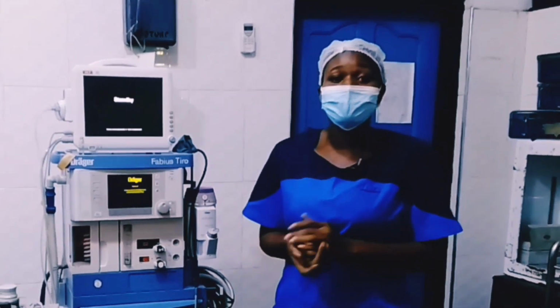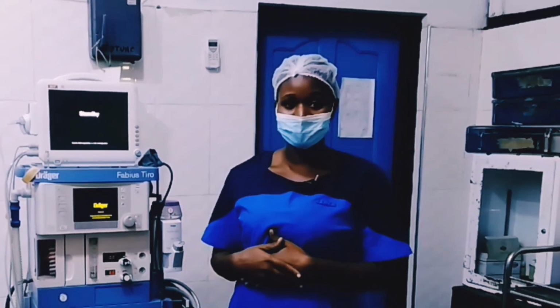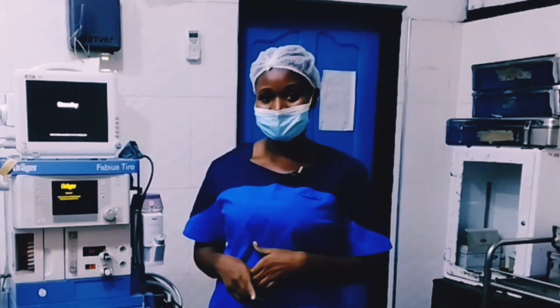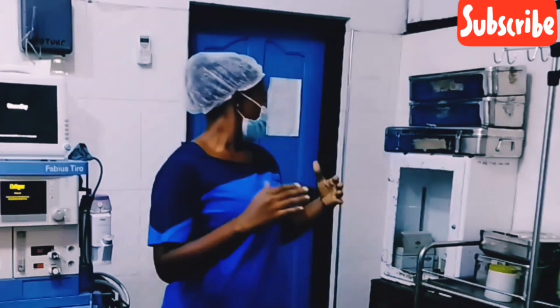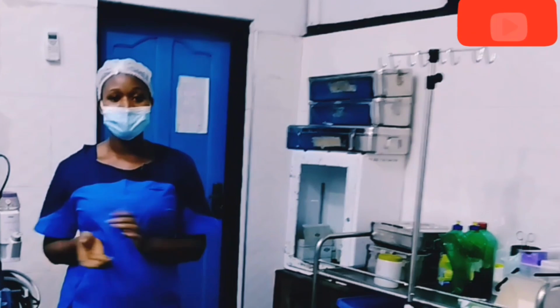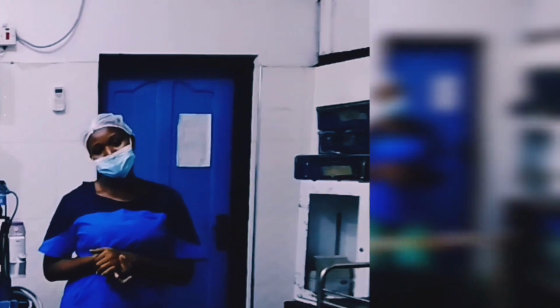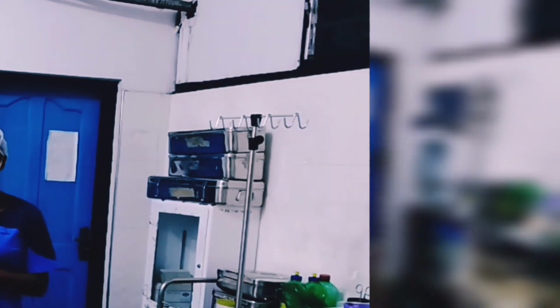Today, I'm taking you on a trip to the theater, and I have a resource person who is going to teach us and take us through the instruments and a lot of things that we need to know about the theater setting. Right now, as I'm standing here, you can see from the background that it's indeed the theater. So I'll take you through a lot, and you get to like the environment and know what goes on in the theater setting. Stay tuned and we'll be right back.